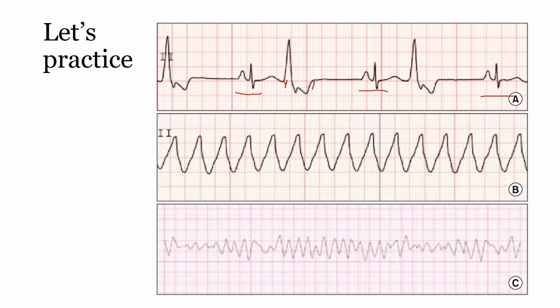This is the ventricles just quivering. So we have VFib here, ventricular fibrillation. And it looks like there are definitely big movements of this. So this would be a coarse VFib. So we're going to practice a whole lot more in the classroom, but go ahead and practice with some of these, counting them and measuring them yourself.